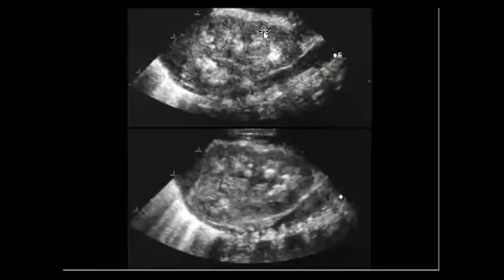They like to show you in the kidney, we mentioned it before, when you find much calcifications or stones. But this patient, if I told you that he is already 3 months old, so he's very young, and you find these echogenic medullary pyramids. So this one could be what is called medullary nephrocalcinosis.